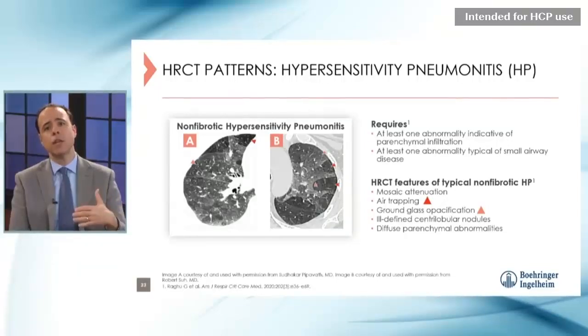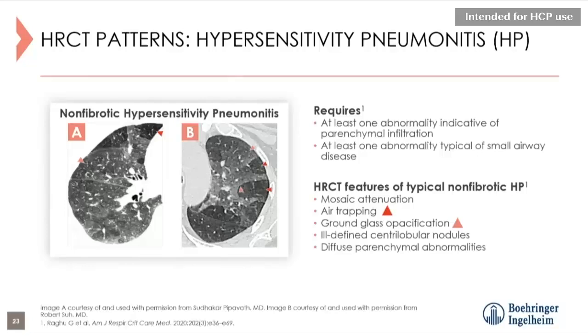And then we get another image at expiration, and we're able to compare the two. When we compare the two, as you can see on these images, you see in the red arrowheads areas of geometric, almost like big, large pavers or flagstones, that are different in color from the adjacent parts of lung. It's almost like a patchwork or mosaic of gray and black or gray and darker gray. That pattern is called a mosaic attenuation pattern and has been seen with air trapping.